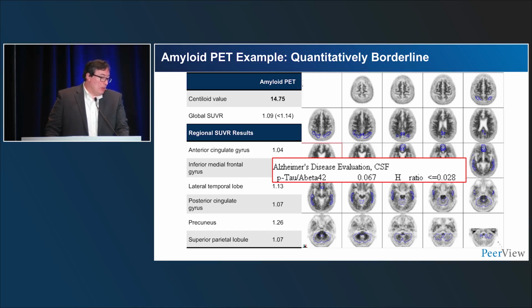And if we want to make sure, we can look and see if they've had prior other biomarkers. And in this case, CSF was abnormal and supports that this patient has abnormal amyloid deposition. But these are the cases that are challenging. I'm going to show you a little more challenging cases than you'll probably see in most of clinical practice. Usually they're easy to classify. But depending on your patients, 10 to 20% may fall in this more challenging range.